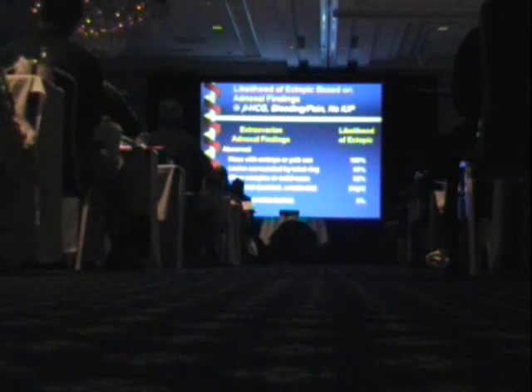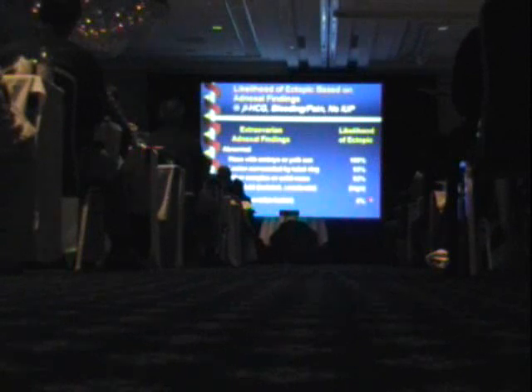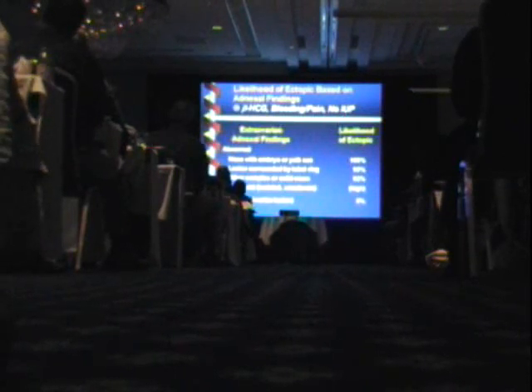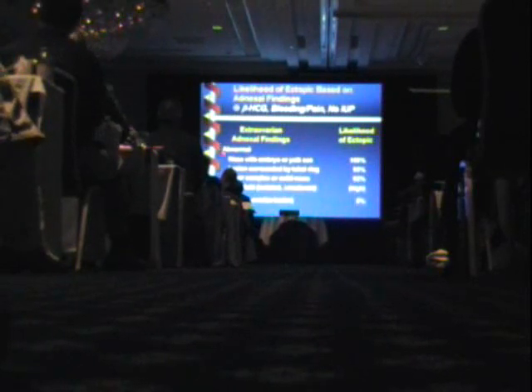How do we put those two key questions together? Well, this table comes from a paper published several years ago in Radiology by Rusty Brown and myself. Rusty used to work in our department. If you have a rule-out ectopic patient, a woman with positive pregnancy test, bleeding and pain, and nothing in the uterus, then we can come up with a table that gives a likelihood of ectopic pregnancy based on the findings outside the ovary. Basically, if you have a rule-out ectopic patient with nothing in the uterus and the adnexa are abnormal outside the ovary, the chance is high, generally over 90% and up to 100% if you actually see an embryo or yolk sac in the adnexa.